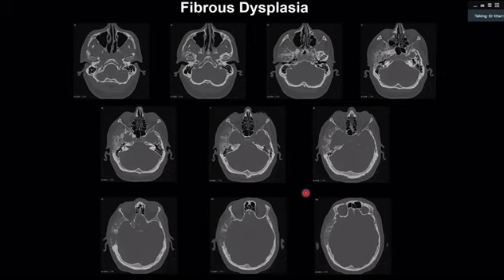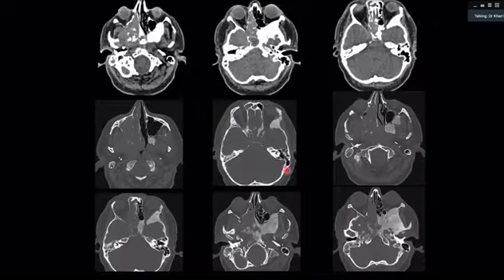There is a radiological type of fibrous dysplasia, which we call Pagetoid type of fibrous dysplasia, in which there are sclerotic as well as lucencies, and this will be difficult. Just on the basis of radiological factors, it will be difficult because it's not classical ground glass. Okay, this is a very good case. Over to you. Classical exam case.